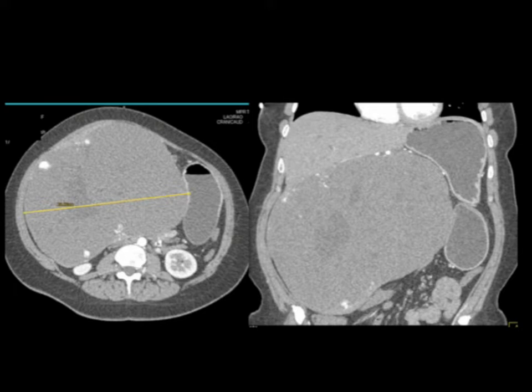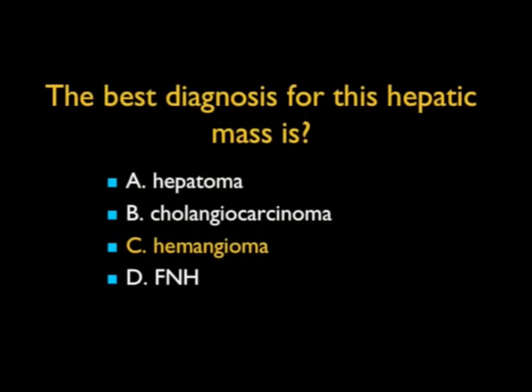We talk about giant hemangiomas being 5 centimeters. If giant is 5 centimeters, over 25 is maybe like a supreme hemangioma. But hemangiomas can be very large. These lesions will often fill in. If I wait long enough, though, you can see the central scar in this patient. So a very nice example of hemangioma. Again, that peripheral puddling, whether it's 5 centimeters, 2 centimeters, or 25 centimeters, is always going to be a very, very critical finding.